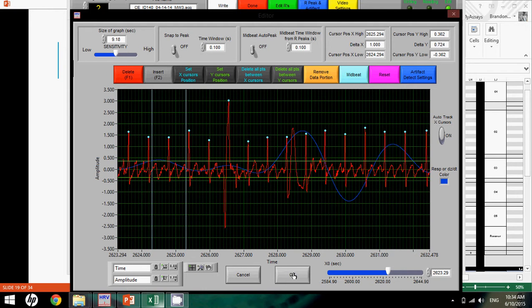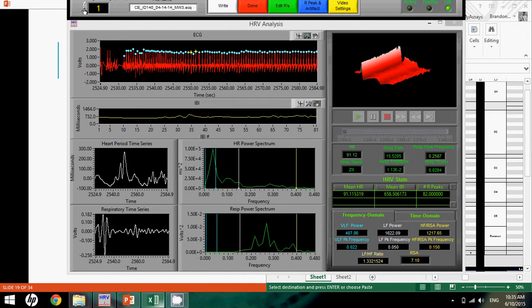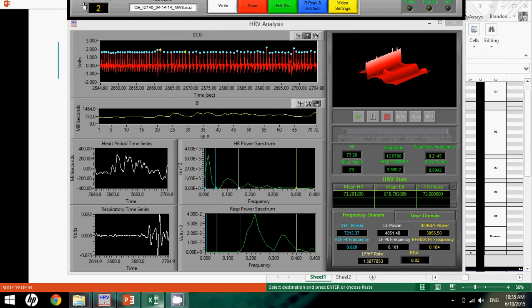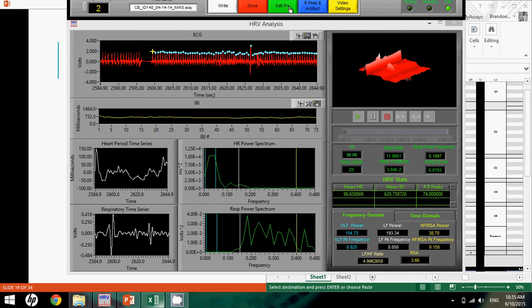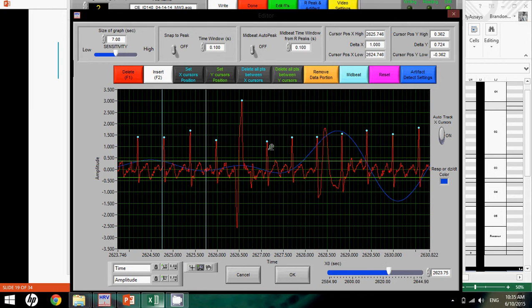Okay, so in this circumstance, it does seem to drastically reduce the RSA. Before that it was 7 and now it's 3.66. Looking around, the last one was 7, the one after it is 8. This is a bit of a tricky segment. So it doesn't look like this is valid, but we'll go ahead and make this last adjustment here regardless.